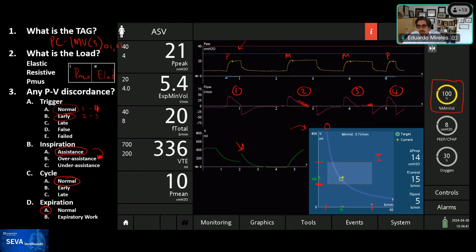the range to avoid air trapping in this patient, or very short I times to avoid dead space ventilation. So that's the OI, explaining that graph, and that's why I like it. It's the O, and then the I actually looks like the box.